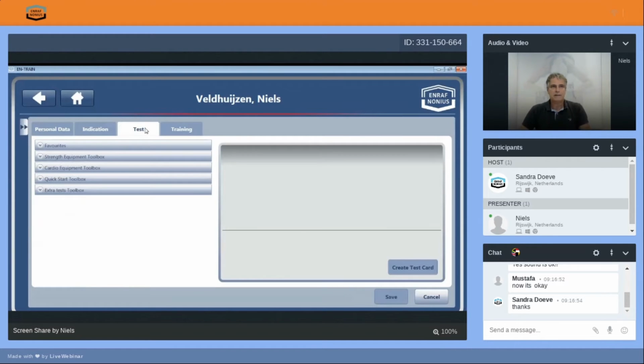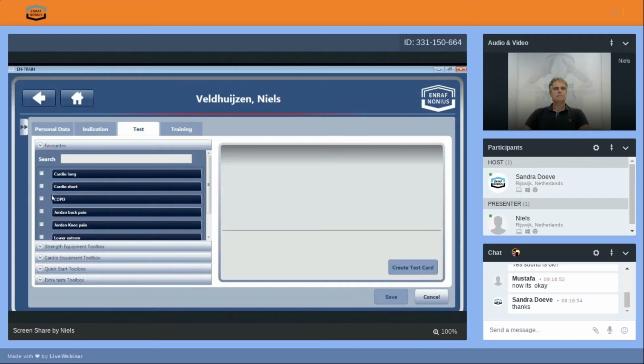So we click on test, and now we can decide what do we want to test? We go to favorites, we click on the COPD, and this is as simple as it can get. And then you click on create test card.